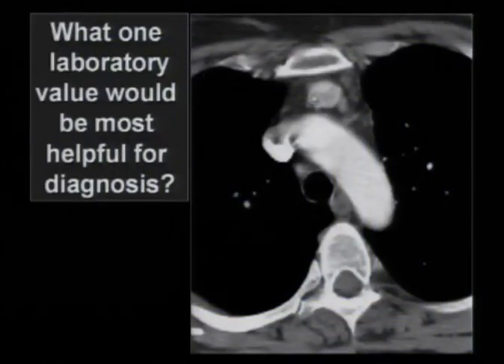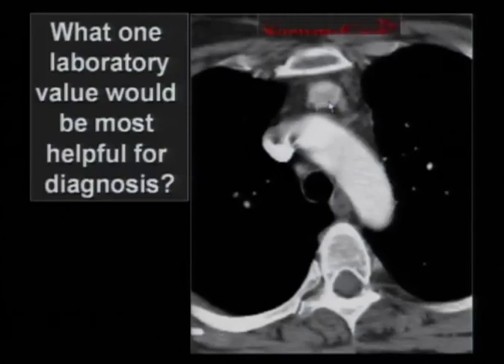This is a very enhancing lesion in the mediastinum. Most thymic neoplasms don't enhance this much. They can have elements that enhance this much. Thymic carcinoid is one neoplasm that may enhance like this. A paraganglioma or glomus tumor in the mediastinum could enhance like this. Turns out serum calcium was up in this patient. This is a parathyroid adenoma, and this is one of the rare locations for an ectopic parathyroid adenoma. The patient had hyperparathyroidism, and hypercalcemia tends to cause those symptoms I outlined.